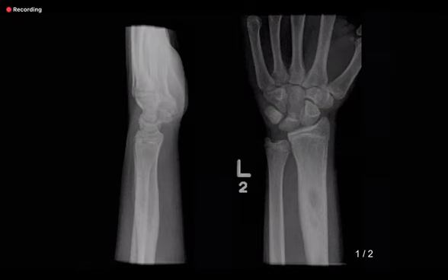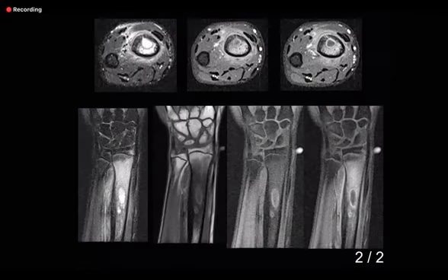Now in this case, the learning points here are very, very important for the exam. And these cases will come again and again. Yesterday also I showed you cases, subtle findings on plain film, and then you do an MR. Is it a tumor? Is it an osteomyelitis? And these will come again and again and again.